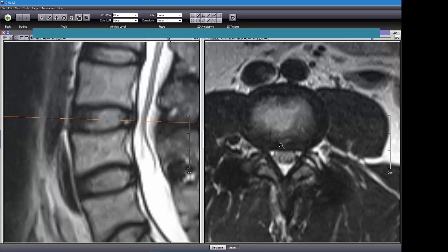So the pars fracture is still there. That can be a source of chronic back pain because the fusion failed to fuse anything. The only thing holding him together is the screws, and they won't be holding him together probably forever. They're going to break eventually. So that can cause back pain. The question is what's causing the left leg pain, and that I'm not 100% sure until I see that flexion extension study.